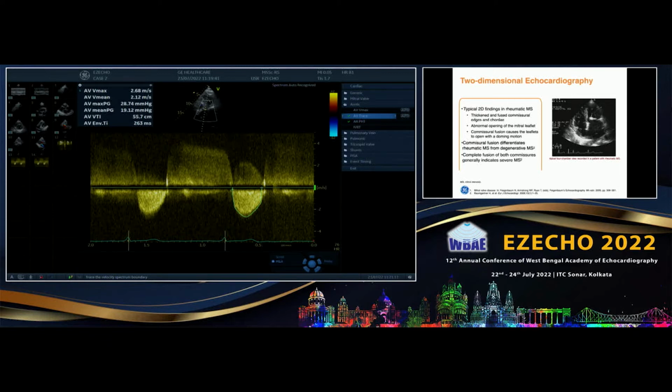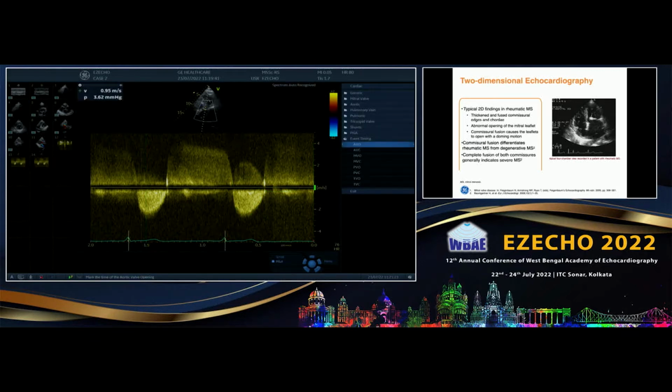So that is why always look whether you have got an early peaking gradient. Now here it is almost early peaking because it is less than one third of the systole. Even the shape of the envelope matters. See, if the peak velocity comes somewhere here, we know that we are underestimating the velocity because we are not aligned. So these times are so important. These envelopes have so much information to tell you.